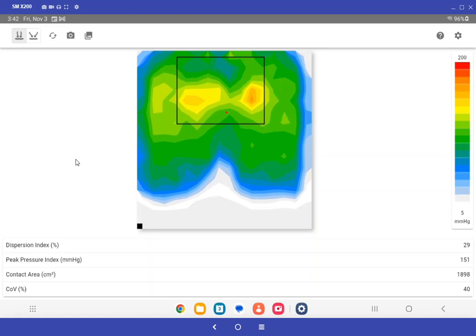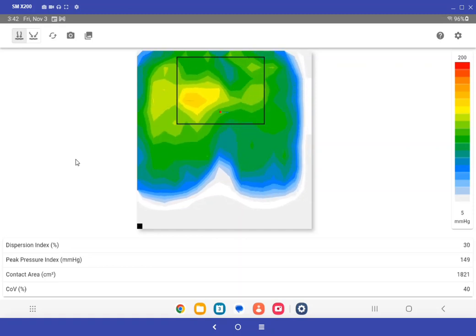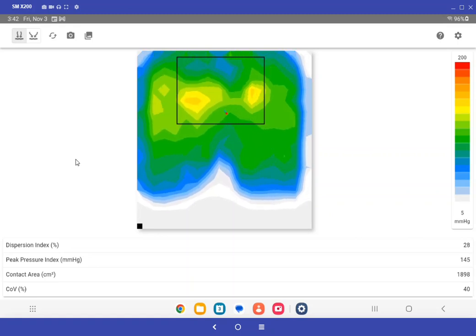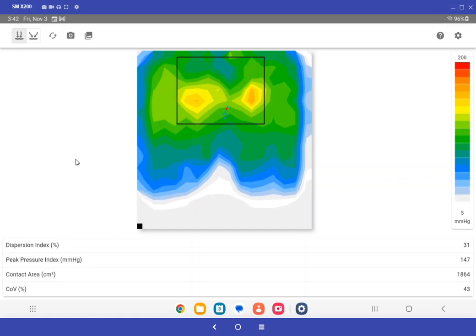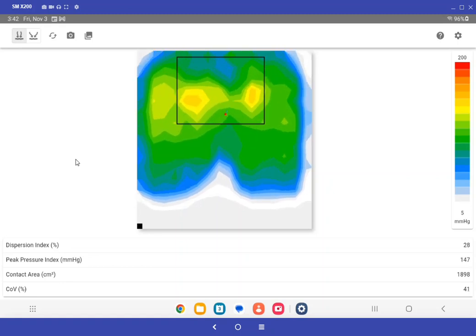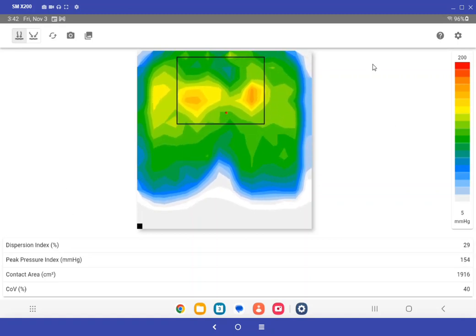Typical seating protocol for building a file per the ISO standards is in their existing seat system if they have one, secondly perhaps on a mat table so you can identify where all the bony bits of the pelvis are and how they're oriented. Thirdly, on a system that perhaps insurance companies would prefer, and if that solution doesn't work, then the solution you want to recommend, and you can demonstrate the effectiveness of that solution. And that in 4 steps covers off most of what you need to do.